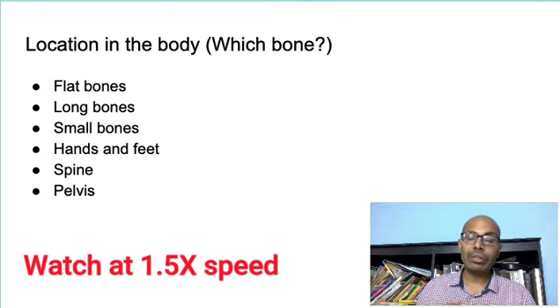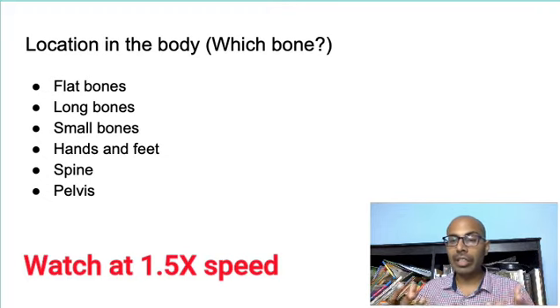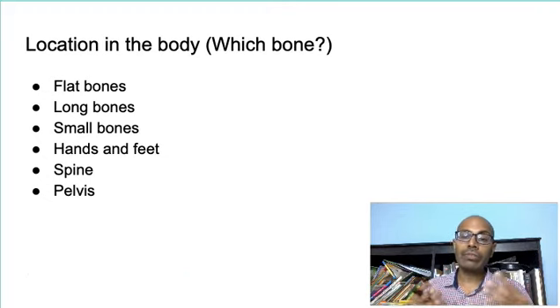Many times the diagnosis is given away straight away in the clinical vignette. However, if you do not come to the conclusion of a diagnosis, you have to look at the X-ray and then start reading the X-ray and finding out the type of lesion and what treatment you have to give if it is a two-step question. So how do you go about reading an X-ray? There are various things that you have to look for when you're reading an X-ray.